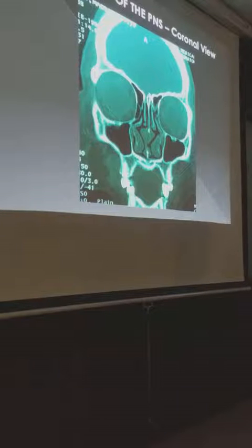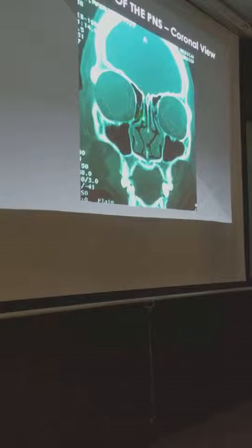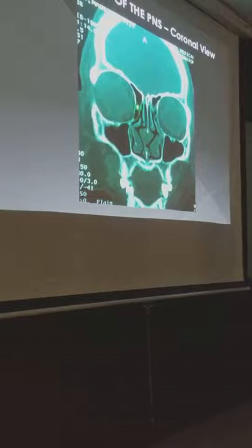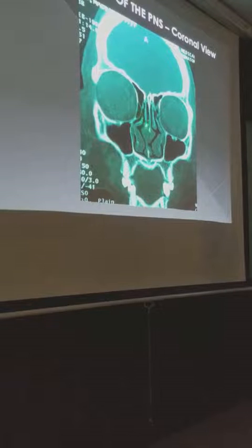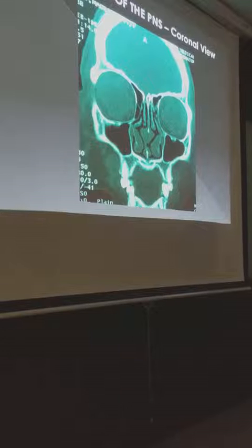It is. Where? In the inferomedial aspect. Agree? Diba? Madali lang eh. Yan. So that's your bulla right there. Bulla ethmoidalis, uncinate process. So you've already seen the first lamella, second lamella. So may utang na lang akong dalawang lamella.